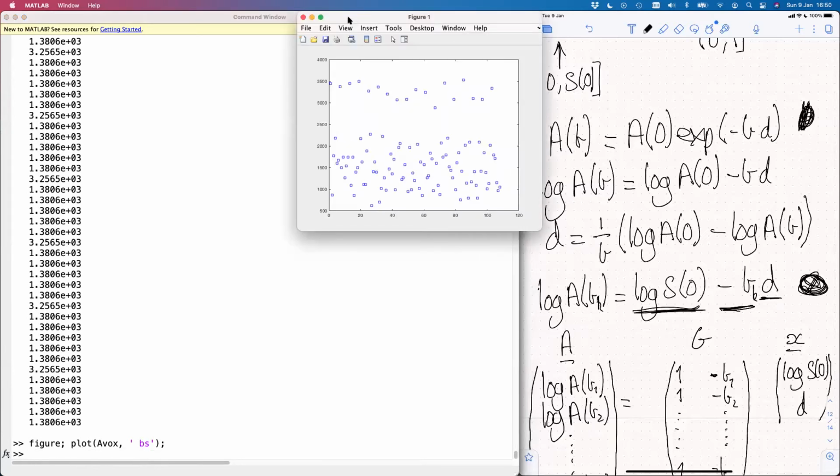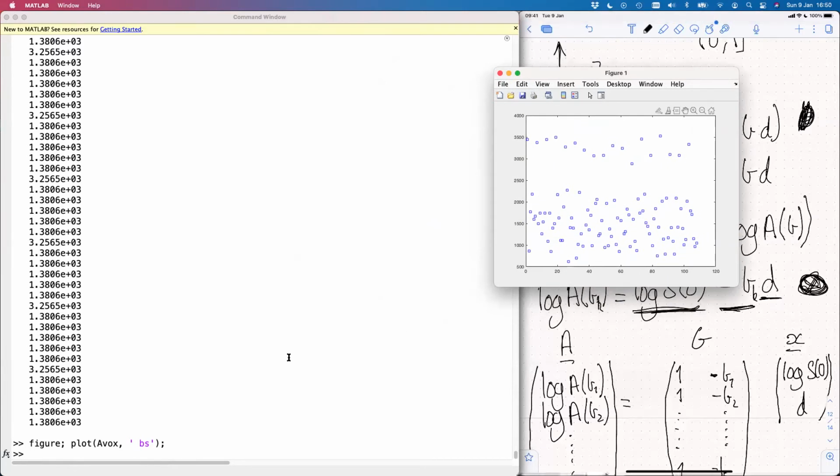So there they are. Just as a function of position in the array. And let's now add to that figure the estimates that we've got from our model after fitting the parameters to those data points.